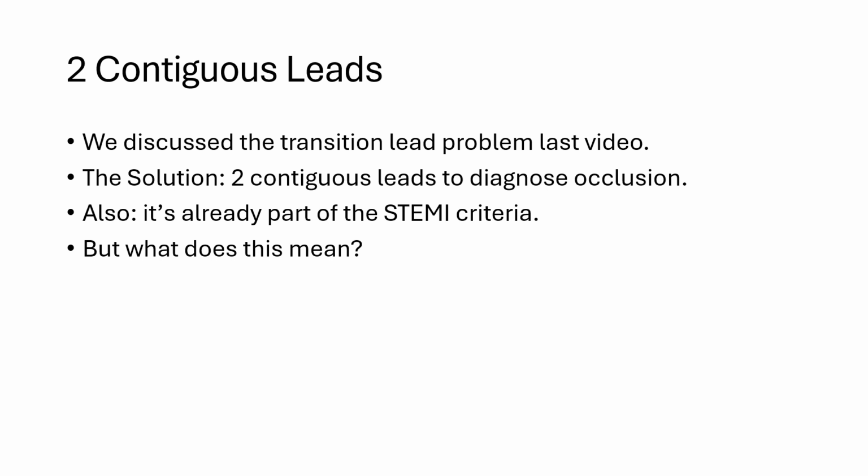We discussed the transition lead problem last video, and the solution we found was two contiguous leads to diagnose occlusion. And you already need to understand this idea of contiguity to understand the STEMI criteria. But what do we mean by contiguity?